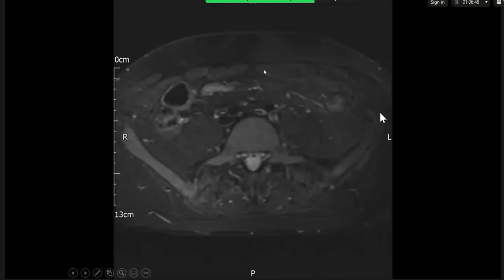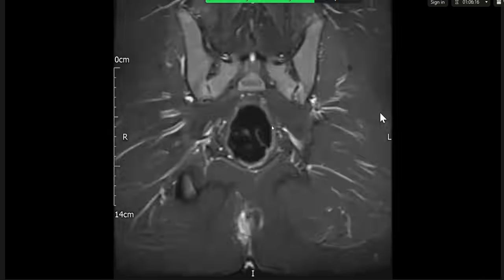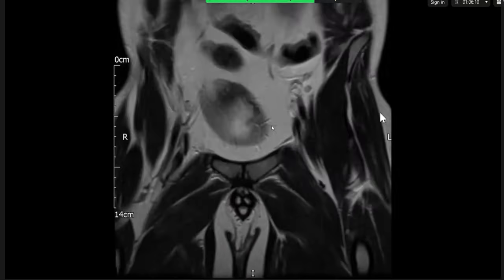So my conclusion, given that this is involving the anal region and the sacroiliac joints, this is likely to be enteropathic arthropathy, and it's most likely to represent Crohn's because ulcerative colitis typically spares the anal region. So this would be my unifying diagnosis, and given these findings, I would recommend referral to rheumatology and gastroenterology. The patient will possibly need an MR enterography to have a look at the terminal ileum and to assess for any active strictures. Okay, excellent.